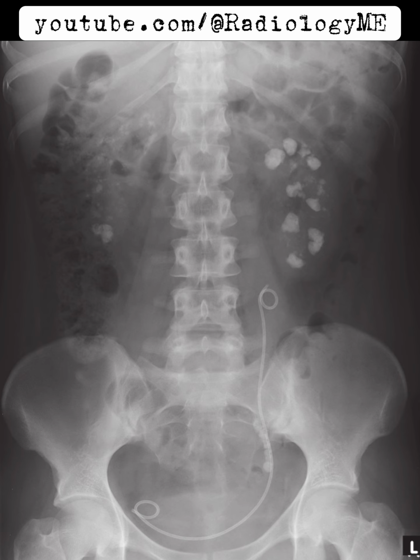form kidney stones. It's typically bilateral and can present with a bunch of grapes appearance on imaging, which is a key detail. They may want to test your knowledge on rare associations like Beckwith-Wiedemann syndrome or Caroli's disease, although these are rare. Now, with that migrated stent, examiners might dig into the complications that can arise. I'd mention things like obstruction, infection, and the formation of Steinstrasse, which is what we're seeing here.